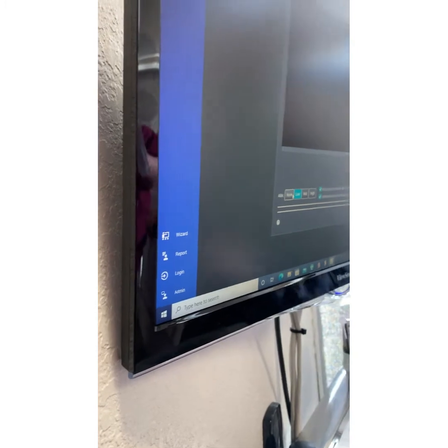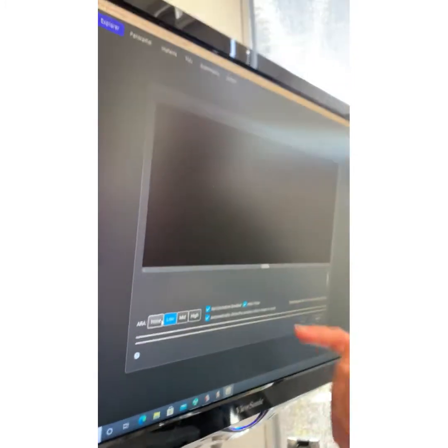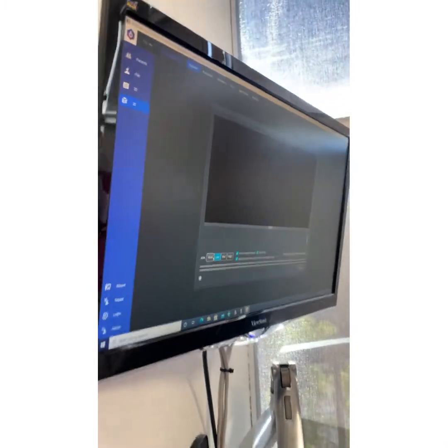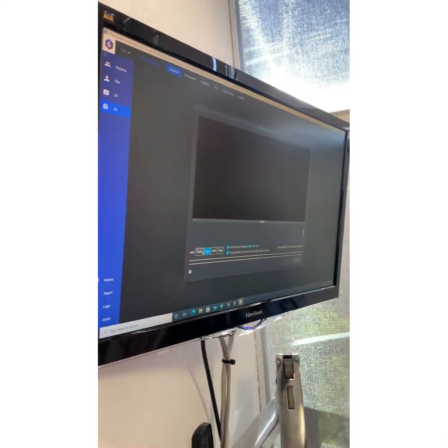Do you recommend mid all the time? I recommend mid or high for all adults. If you have a child in here that has no restorative material, low is just perfectly fine because this has other properties to reduce noise other than just metals. The guys that send the best volumes from around the country tell all their offices to put it on high every time.